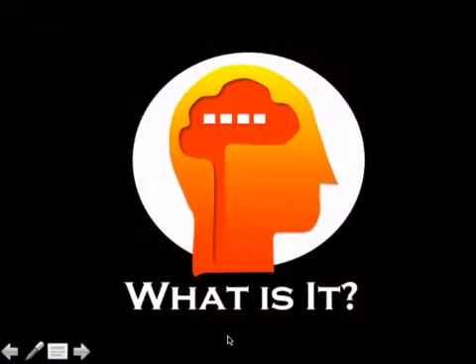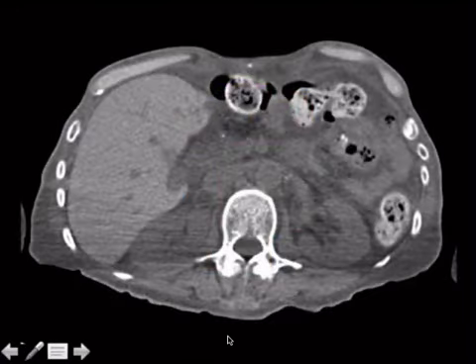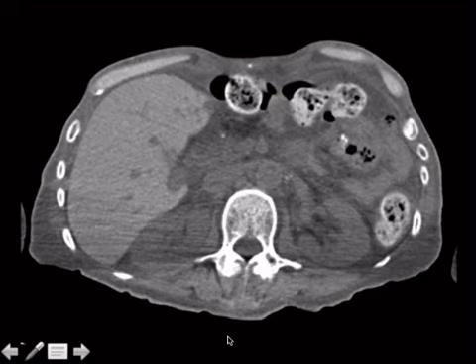All right. Next question. Remember, what do we do first? What are you showing me here? It's a CT. What's the cut through? Cut through the liver. Is it contrasted or not? Well, it's not, right? Look at that. That's non-con. That makes this a very, very dense liver.